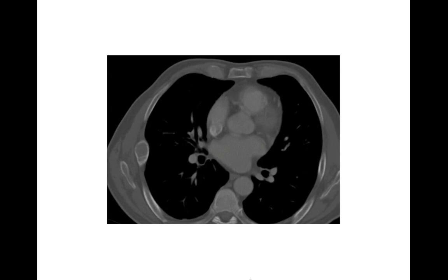This certainly could be a brown tumor. Brown tumors, you can have multiple brown tumors, and brown tumors can occur just about anywhere. Could this be metastasis? Sure, it could be a metastasis if they had a history of malignancy. Could this be a multiple myeloma or plasmacytoma in an elderly patient? Absolutely. I think those are the main things to consider here. Enchondromas usually aren't quite so expansile. There's no chondroid matrix in this case. It's possible you could throw it in there. That would probably be my limited differential for this case. This one turned out to be a brown tumor. They had multiple lesions throughout their skeleton, and they had a parathyroid adenoma causing hyperparathyroidism, which was causing all the brown tumors.